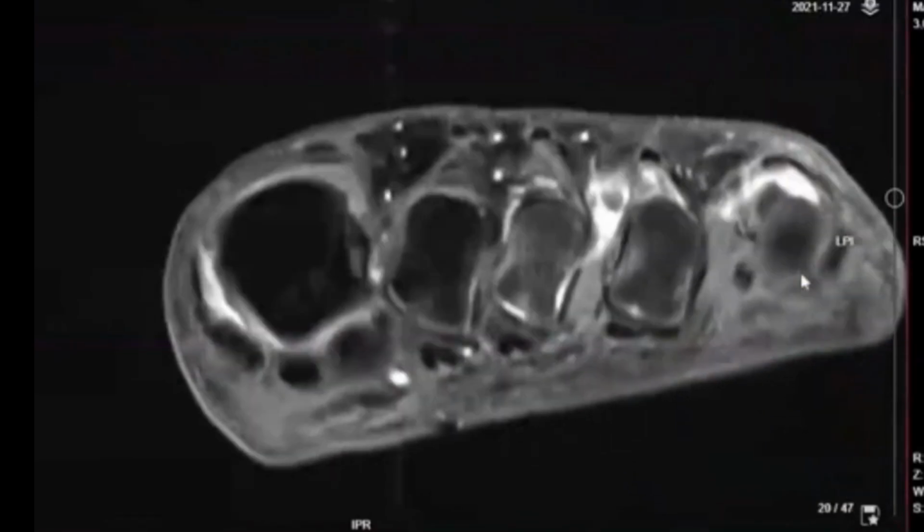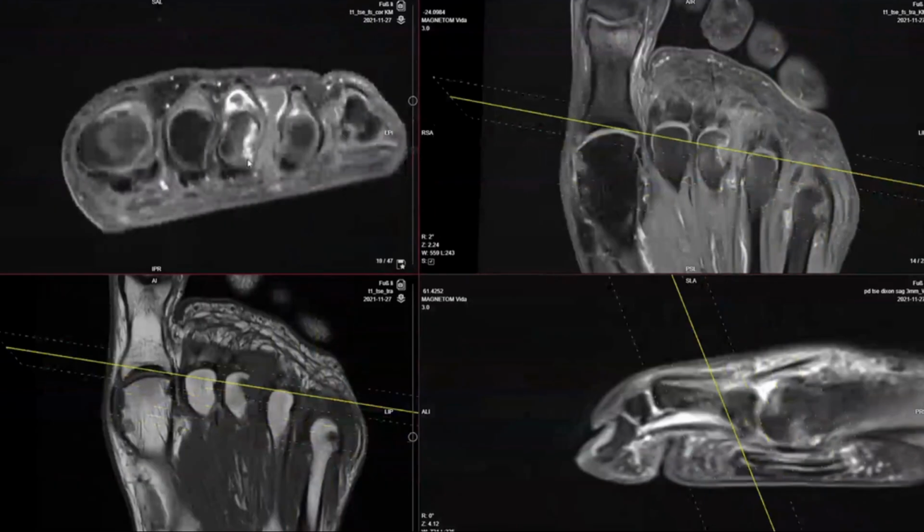And when we look at the sagittal images, you can appreciate the high-grade tear that's occurring on the fibular side of this articulation. So again, pseudoneuromas versus neuromas, the important distinction is twofold. Eccentric pericapsular fibrosis, now recognized as an important and useful correlate.